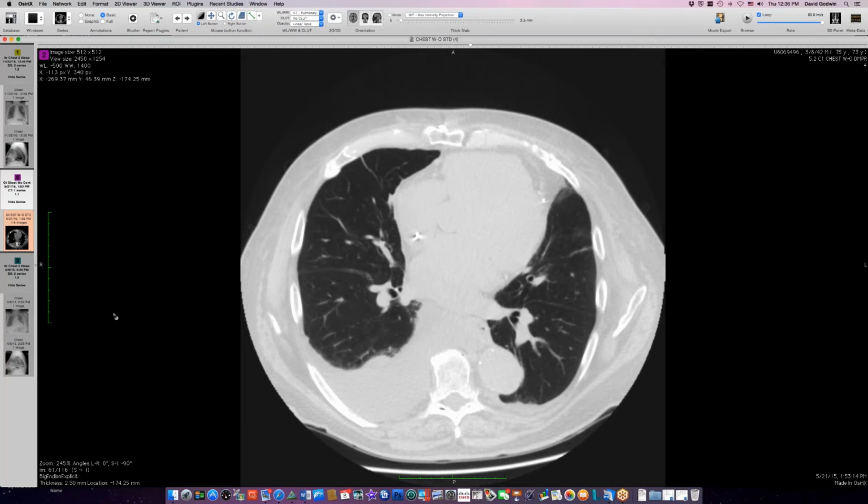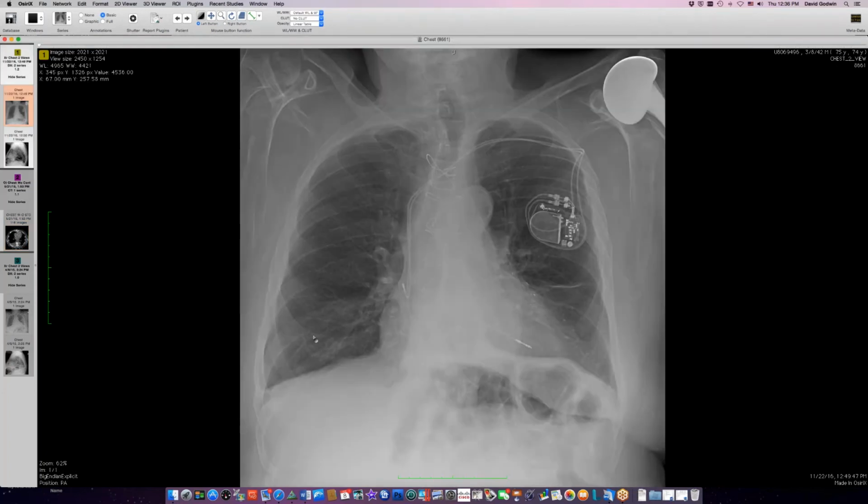Is this familiar? Here's what happens after the amiodarone was withdrawn. You can see that his pleural effusion is gone, and the stuff on the left was all just effusion and not actually pleural thickening at all, because it's cleared up dramatically. So put that on your list of causes of pleural effusion, especially an exudative one.